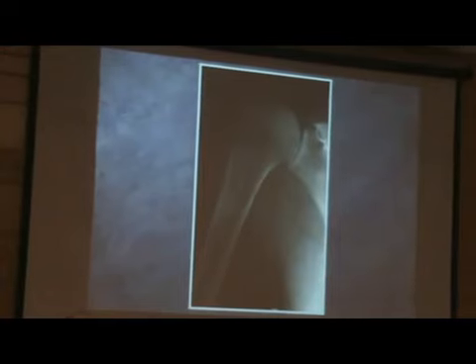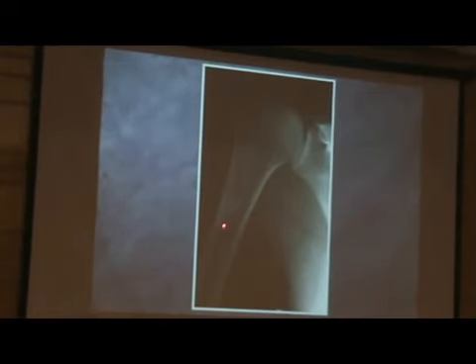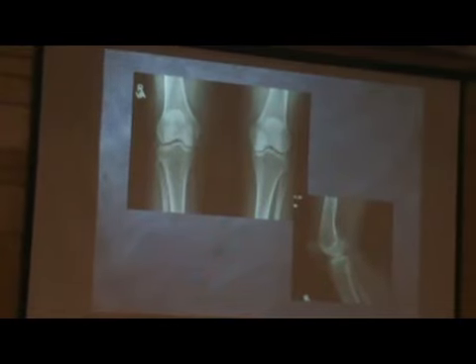Fibroosseous matrix is less common than the first two, and the typical examples are going to be fibrous dysplasia and some healed NOFs or healing NOFs. There's a case where it's almost ground glass-like matrix in the proximal humerus. This is quite benign looking, and it's a patient with fibrous dysplasia.